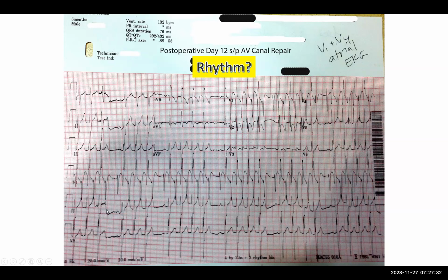But I guess what I'm trying to say is that seeing the group beating, as I'm seeing here with block in between, at this type of rate. You could have group beating with sinus arrhythmia at slow rates, but this is much faster, obviously. The R to R intervals on the conducted beats are around 150 beats per minute. So I would be thinking about whether this is a Mobitz 1 block, just based on the presence of the group beating. And once you see the atrial electrogram, you can see that when there is a pause, it's because there is non-conduction from the atrium to the ventricle.